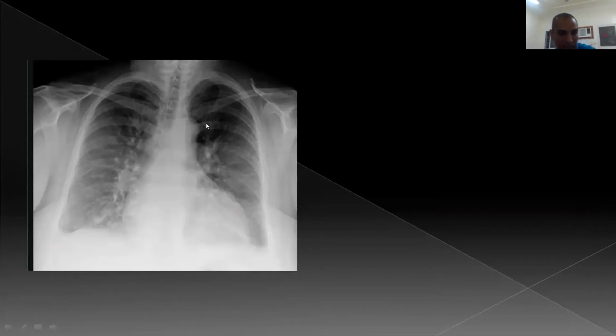This one, we have here distended upper lobe vasculature, and this is one of the starting signs, the beginning of forming pulmonary edema. Distended upper lung lobe vessels, and we also have interstitial lines here and here and here, perpendicular to the chest wall, what we call Kerley's B lines. And by the way, we have cardiac enlargement, so we have signs of pulmonary edema, most likely cardiogenic.